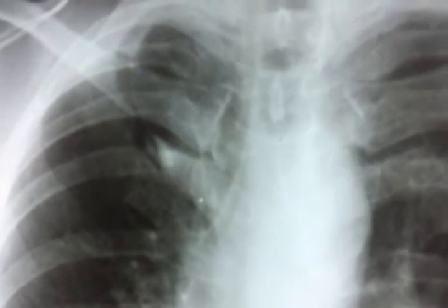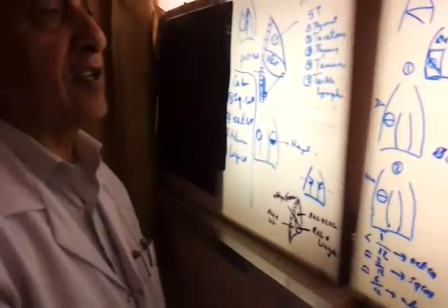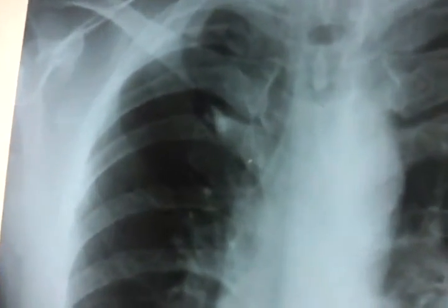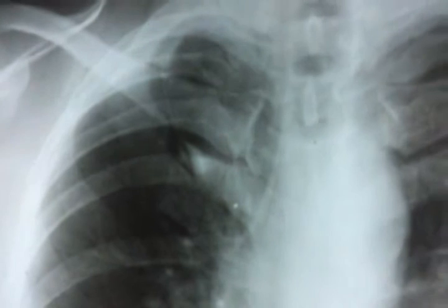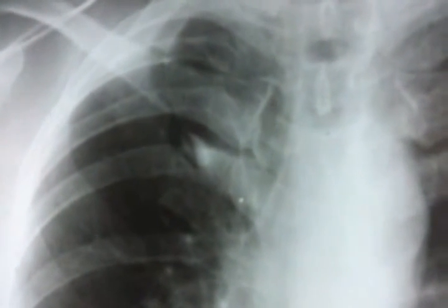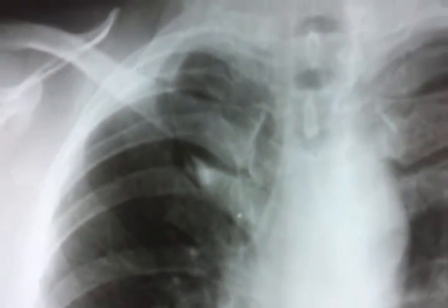It is rare and of no specific disease significance. Sometimes it becomes a lobe, an azygos lobe they call it, when the pleura is pushed back to get a lobe. Certain diseases might occur in that lobe.